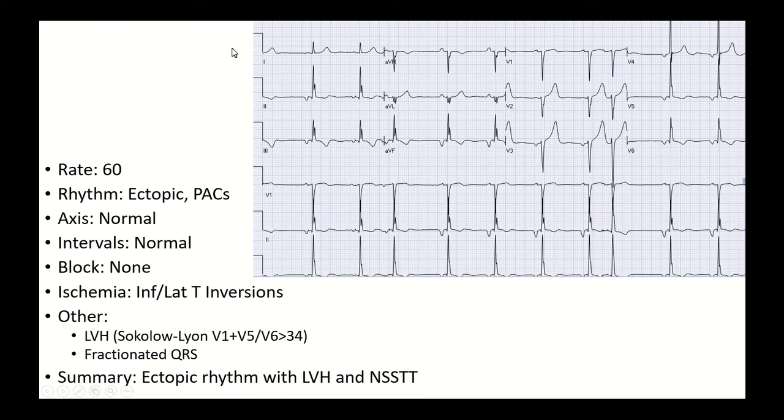So in summary, I would classify this as having an ectopic rhythm with PACs, left ventricular hypertrophy, and non-specific ST wave abnormalities.